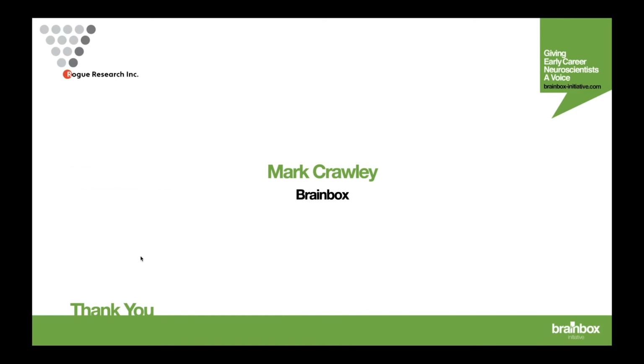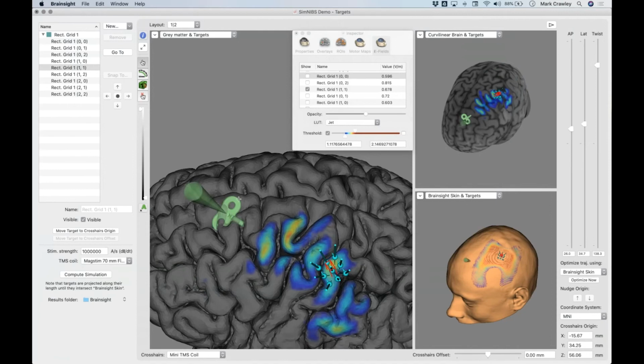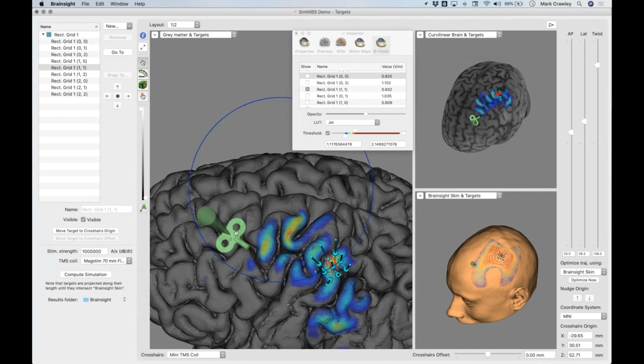So one of them, which is related to when you chose your little grid earlier: how did the grid center get chosen? The grid center is chosen as I move this green cursor around here; the grid center will be wherever this is.